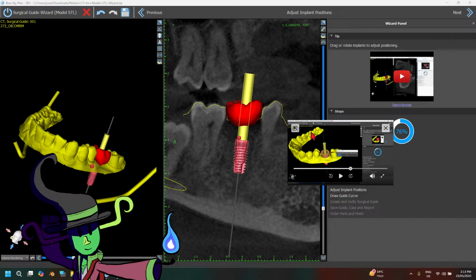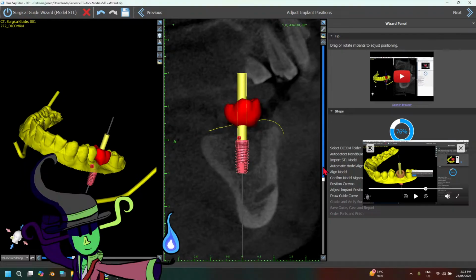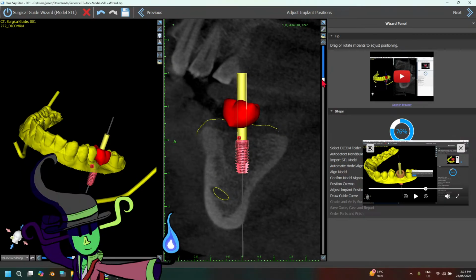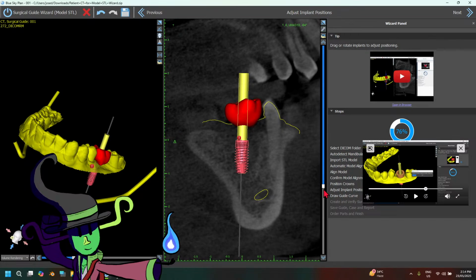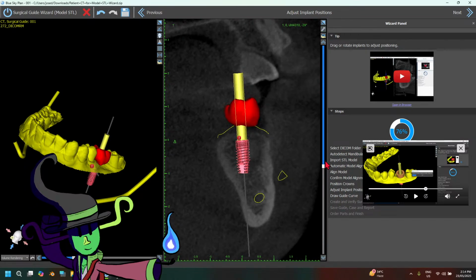Anyway, if you guys have any ideas on how to improve in this case, you can go ahead and leave them in the chat. Give me some ideas on how implant planning works in general. Let me know if I am good so far with this implant.